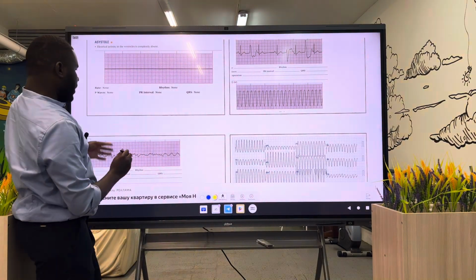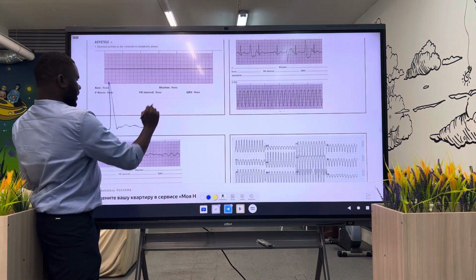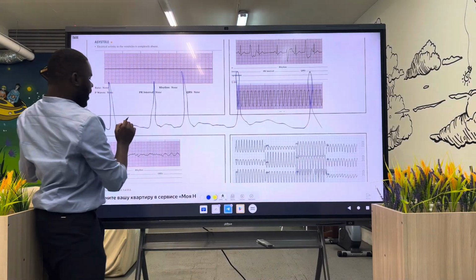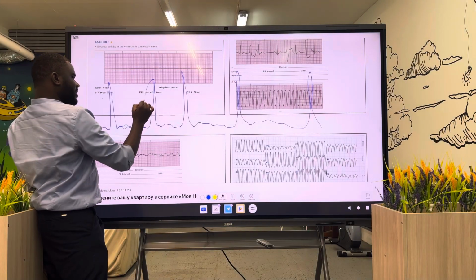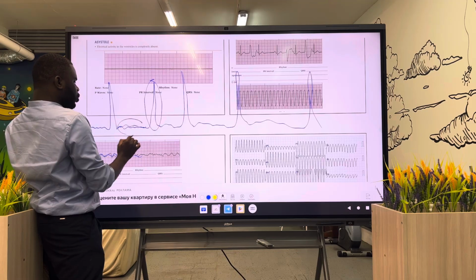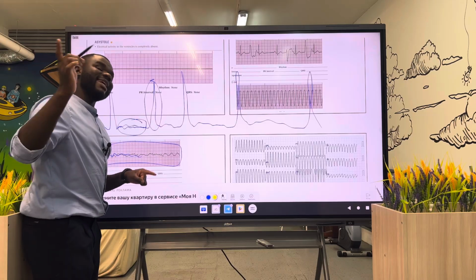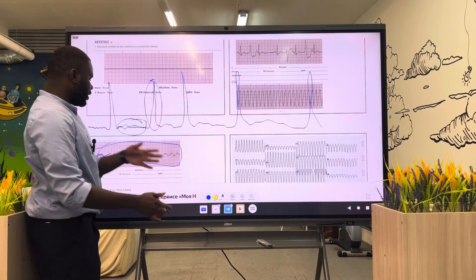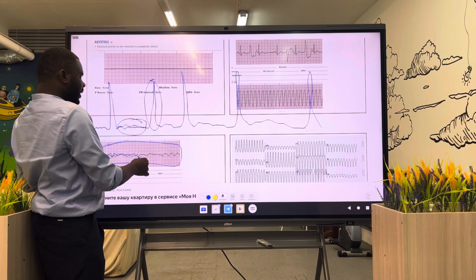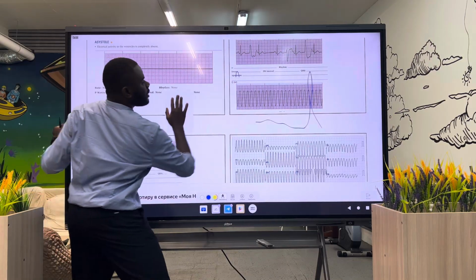So, if you see this one, this is AFib. You can see the fibrillatory wave and you can see ventricular contraction, right? But here you just see fibrillation. It's like you took this one and just placed it here. I told you the ventricle is very stingy. Whenever it is misbehaving, it takes all over the ECG. Now we can't see anything apart from ventricular contraction. Immediately we know this is V fibrillation. Fibrillation is usually smaller than tachycardia or flutter.